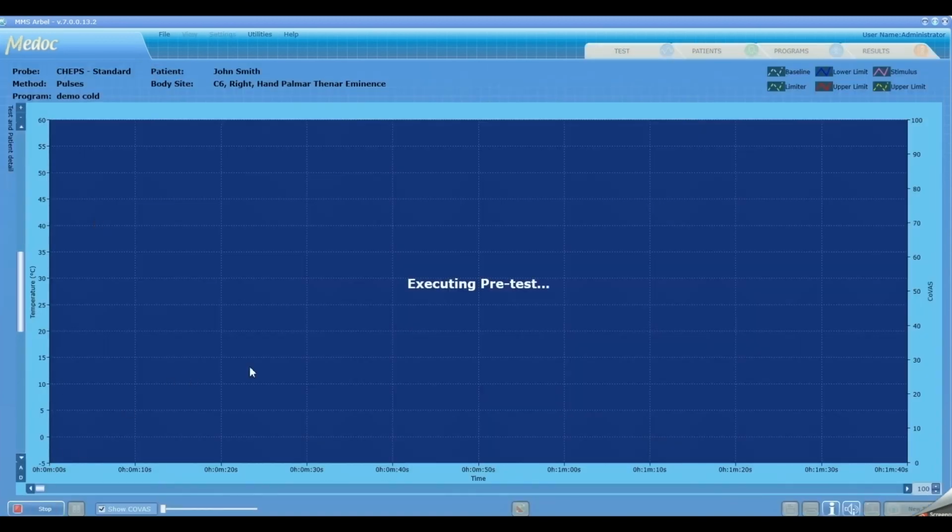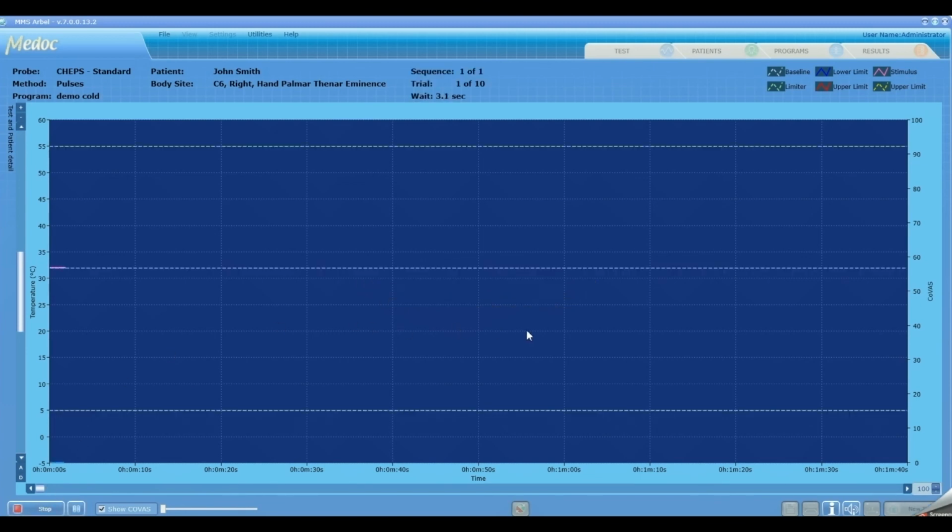And you will see a small asterisk at the onset of each trial. When the asterisk appears, it shows us that the TTL event was sent, and if any external device is connected with a TTL cable to our TSA2 device, it will receive the TTL event and it will mark something or trigger something on the external device.